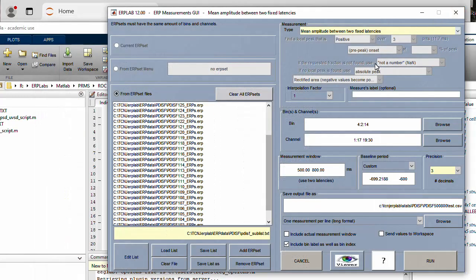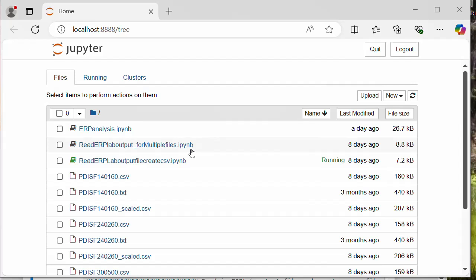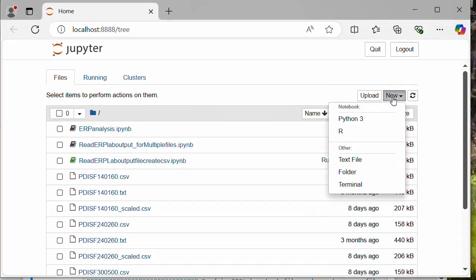And then, so let me close this all out so that we can get this cleared up and out of the way. And so what we're going to use is Jupyter Notebook. So this is Jupyter Notebook. I have a separate video that shows you how to install it. This is a wonderful thing to use. You can create a new notebook. Now, the cool thing is I have Python 3 set up here. And then you can also install R to run in Jupyter Notebook. So it's really easy just to switch back and forth.